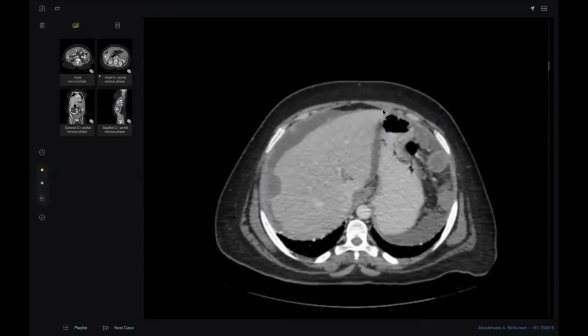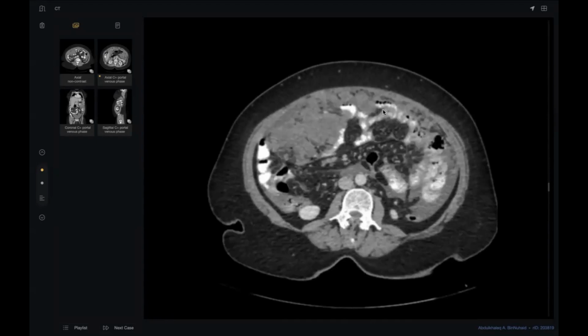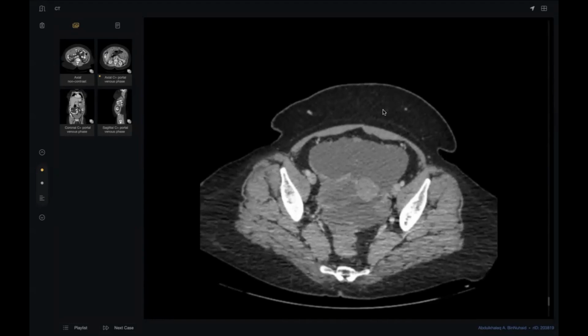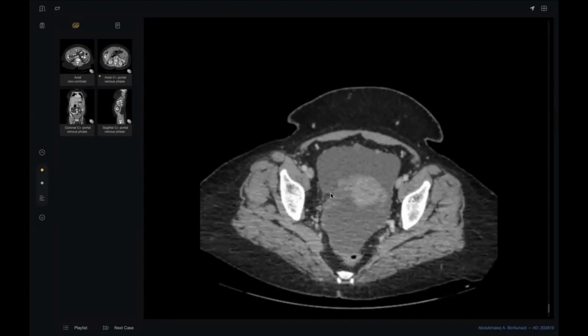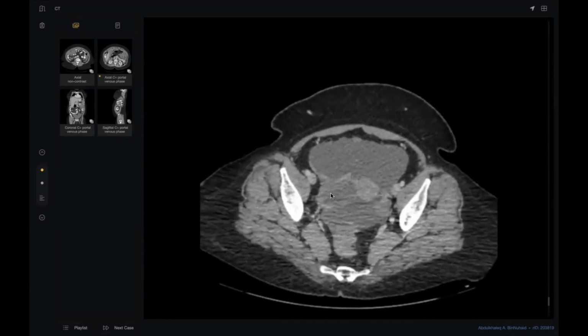Really, I'm so impressed. This is a case of metastatic right ovarian cystadenocarcinoma. Why right, not left? See, at least there is some nodule enhancement here. Sure, we need MRI to be sure of the site of everything in the ovary, but at least there is a clue here.